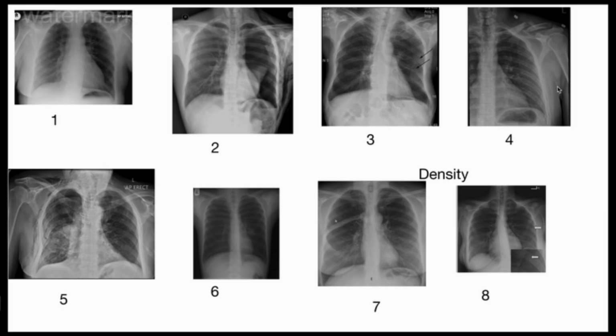especially when one is talking about trauma, but of course also rib fractures. As you can see in some of these, image 5 shows us the rib fractures, and of course the lucent areas which show the subcutaneous emphysema. So this gives us a view. Before you attempt to interpret your radiograph, make sure your chest wall is normal in terms of size and densities. Here are some of the examples.